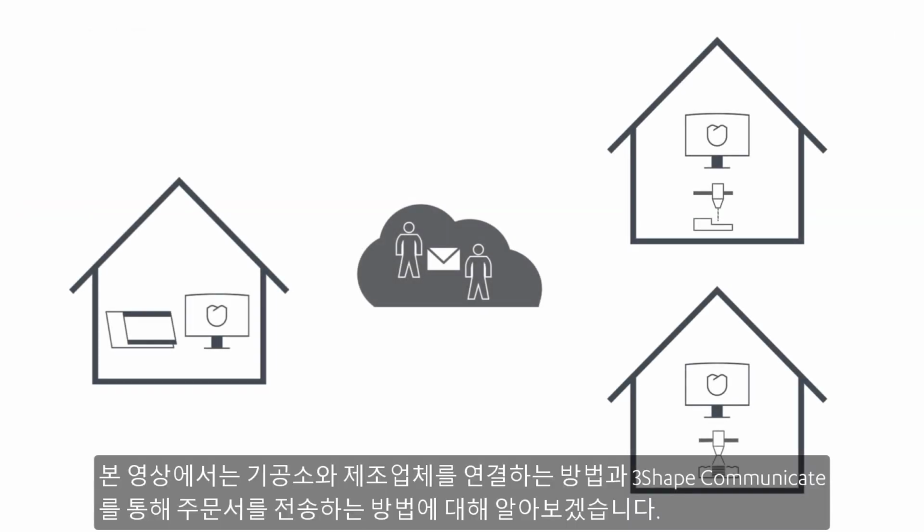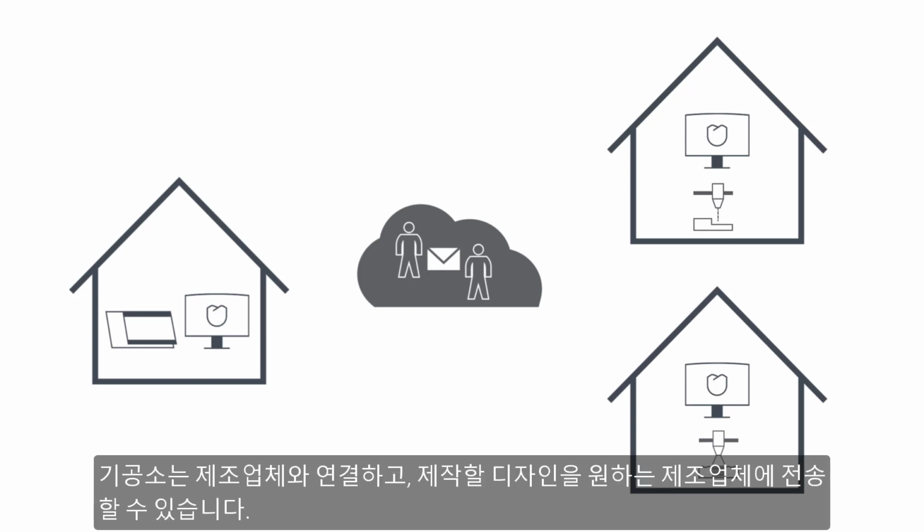While watching this video, you will learn how to connect your lab to a manufacturing center and send orders via 3Shape Communicate. Connection to a manufacturer gives you the opportunity to send out your designs to manufacturing centers of choice.